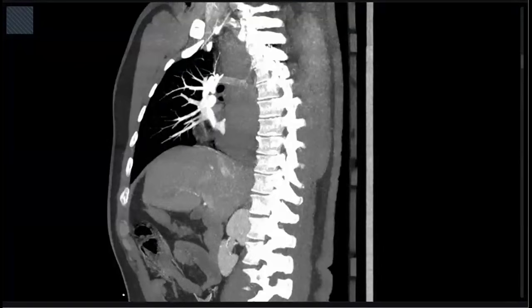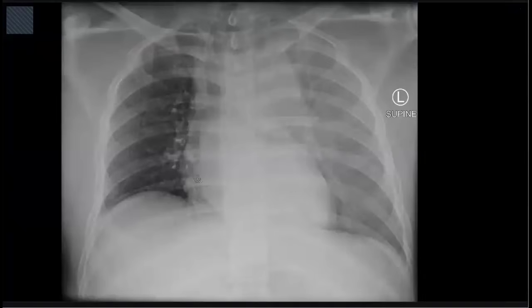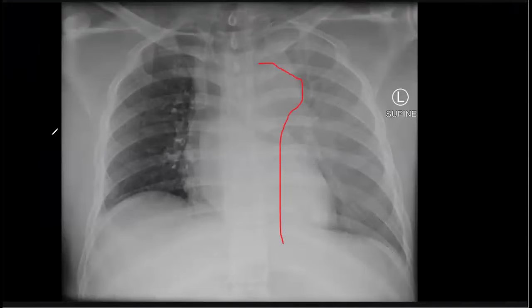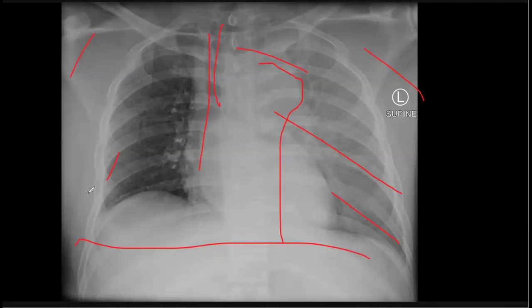You need more practice, I think. This case: motor vehicle accident in a young patient, mediastinal widening, left apical capping, veiling of the left lung field. We couldn't appreciate the aortic knuckle or the descending aorta well, and there is mediastinal shifting to the right side. We couldn't appreciate any rib fracture or scapular fracture; upper abdominal cuts are unremarkable. So this is an emergent case.